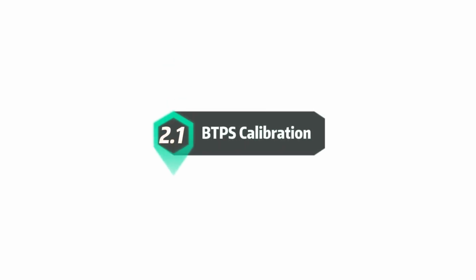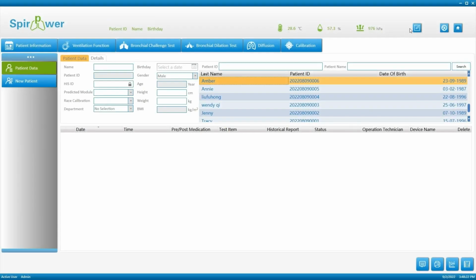BTPS calibration. Automatic BTPS calibration. Manual BTPS calibration. Click on the Edit button to make changes. Then click Save.